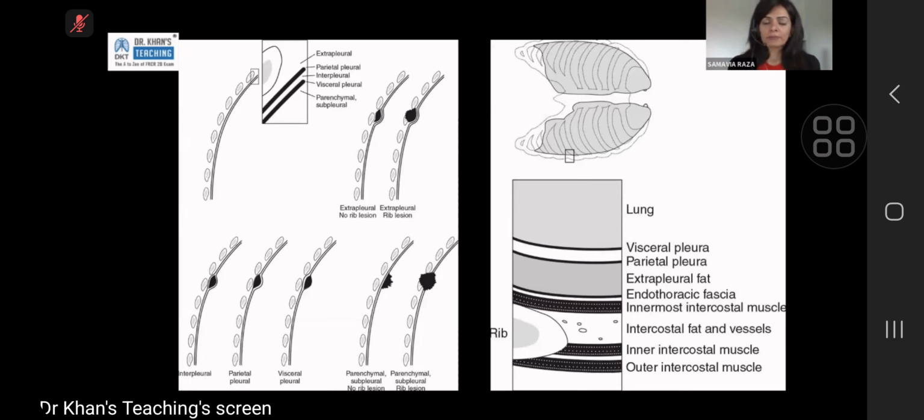You could see it in thick patients. You could see it in certain people who are even not thick, but they are slightly more prone to it. Some people have very prominent mediastinal fat, but the two can be separate or together at the same time.